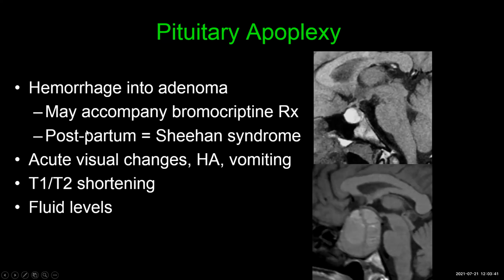This is often in the postpartum setting, in which case it's called Sheehan syndrome, but may also occur in the setting of patients who are being treated medically for a pituitary adenoma. That sets them up for potential hemorrhage into the adenoma, also called pituitary apoplexy. What we see is odd signal. We will see a pituitary adenoma.